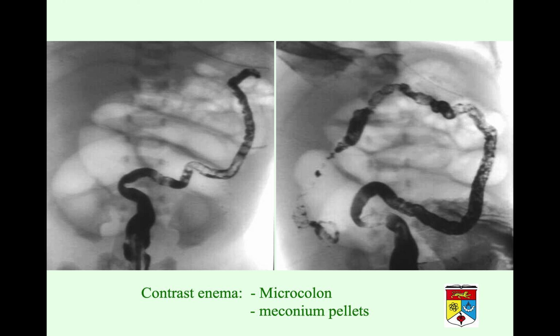Now, in low bowel obstruction, we will do a contrast study. Why? Because we want to delineate what is happening in the colon. You can remember that the bowel just now was so dilated. Then you do the contrast enema, where you introduce the contrast into the rectum, and it opacifies the large bowel, and you see that the large bowel, which is supposed to be large, is small.